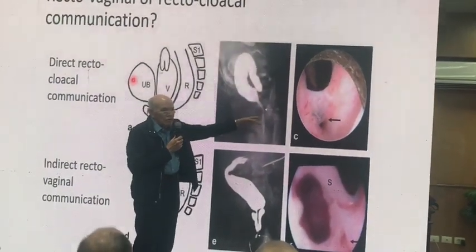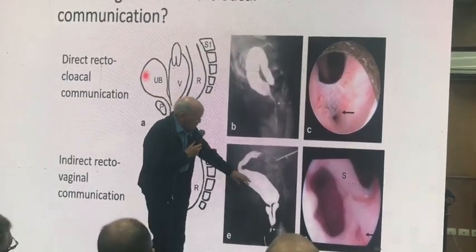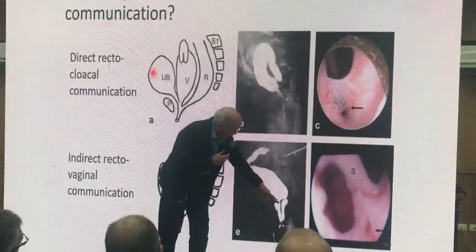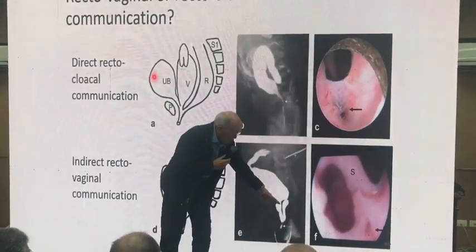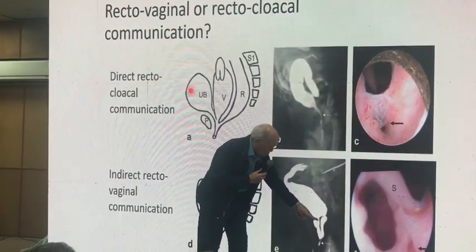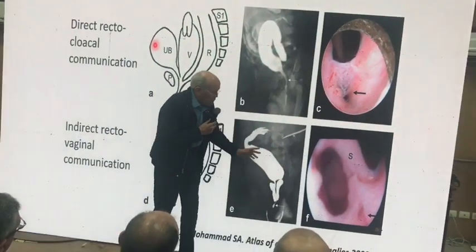This is useless. And then in this X-ray, the same thing. This is an AP film, and the rectum is here, but we don't know where this is in the pelvis. We don't know if this is above the coccyx or below the coccyx. And then there is this structure and this that I don't know what it is.